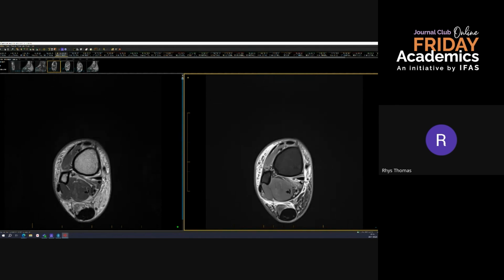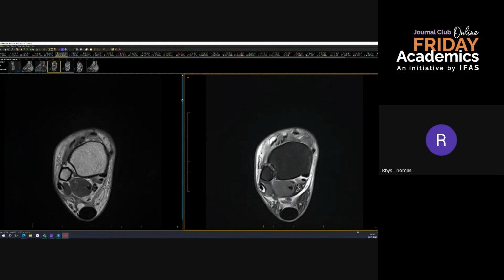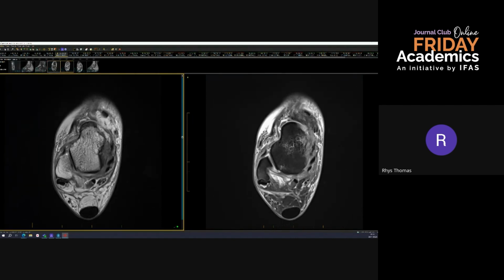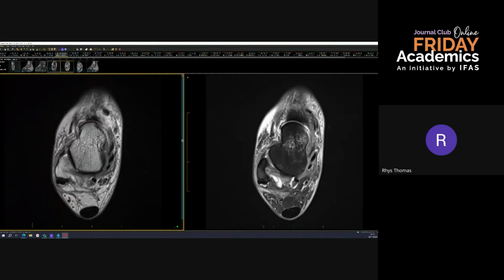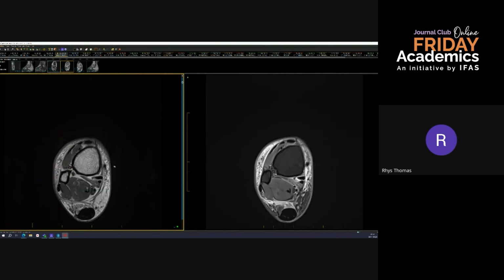And so then you can see whether the nerve is more hyperintense or more thickened at any one point along its course, and that can give you a more specific answer. But you can rule out compressive lesions certainly with this kind of MR, and anything gross in the nerves. But something subtle that's neural might be a bit harder to identify.